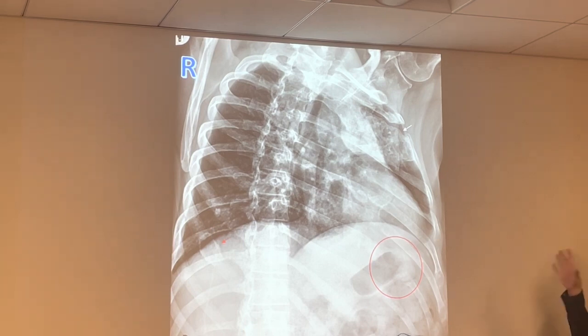if you're being asked this on a test, this is how you identify it on an actual radiograph per the curriculum, guys. Doesn't mean that you're going to do it in clinic, but book-wise, this is how you have to learn it. Okay? Because they may throw an image just like this on your registry and say, what oblique is that? And you've got to figure it out based on the marker and what's elongated. Doesn't matter what you do in clinic.